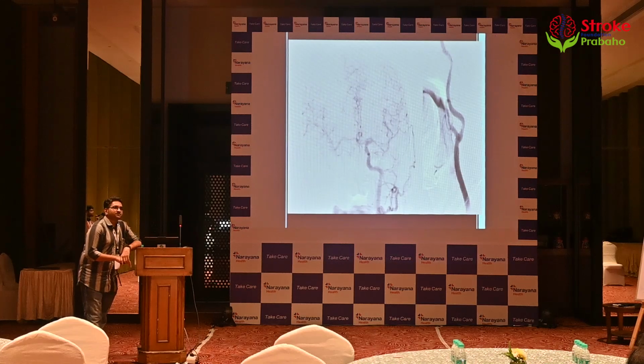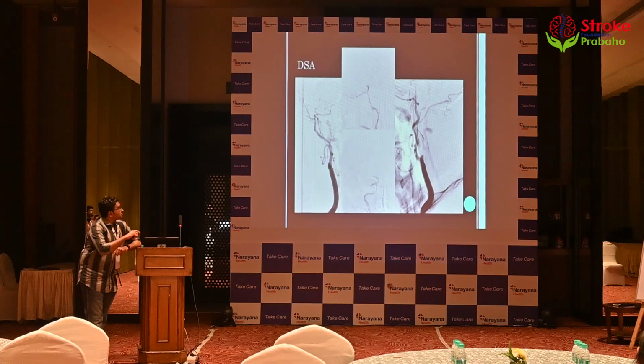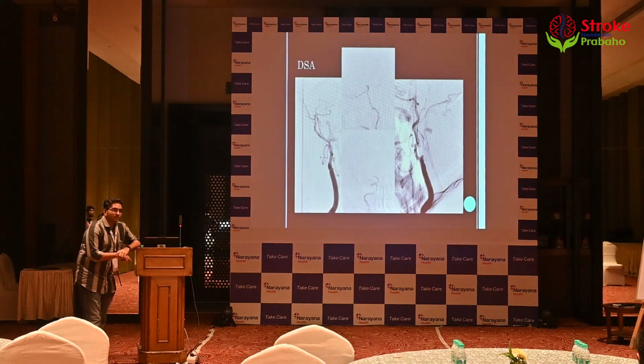If anything, on the right, if it is completely occluded, near total, I will still look at the left to see whether it is still feeding the embolus to the right. But I'm just worried. They told me it stopped at the ophthalmic. I don't believe so. I believe there is antegrade flow. And for me, if this vessel is diseased with still antegrade flow, I'm worried about the failure of antithrombotics.